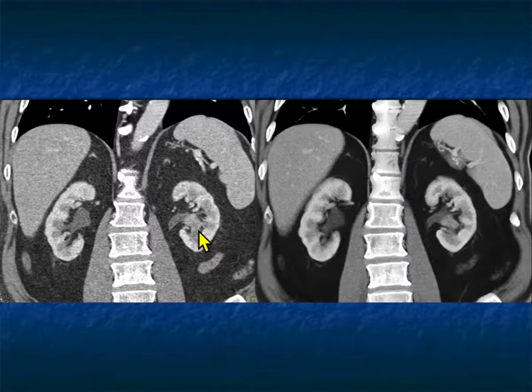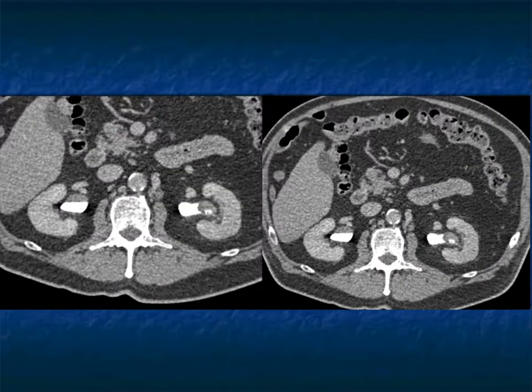Blood clots can look like this but not be that extensive. Renal cell carcinoma, no chance. This is going to be TCC. You can think about other things that cause infection, but again, you're not going to have that appearance. And here it is on the excretory phase. Very nice example. Now, you always need to be careful.